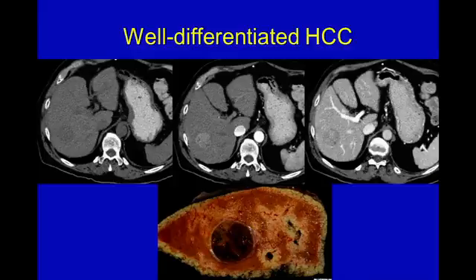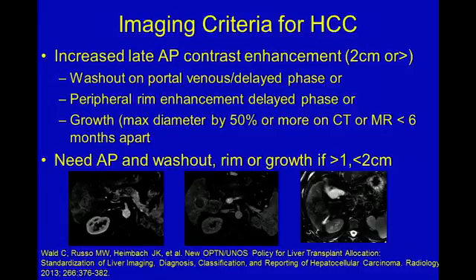This is what we do see when we're using contrasted studies on either CT or MR. And here is a well-differentiated HCC, pre-contrast, slightly lower with comparison to the background of the liver on CT. Enhancement in the arterial phase because it has more hepatic arteries in it than the rest of the liver. And it becomes hypoattenuating on the portal phase because it has less portal flow than the rest of the liver. So we actually use the pathophysiology of the blood supply to tell us what's going on with our imaging.